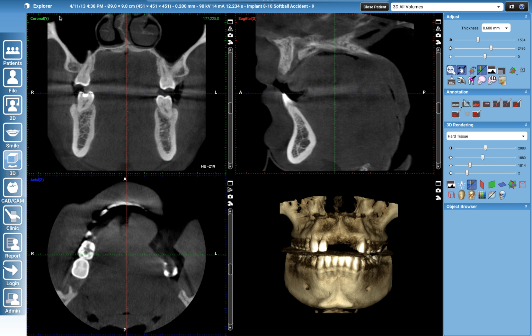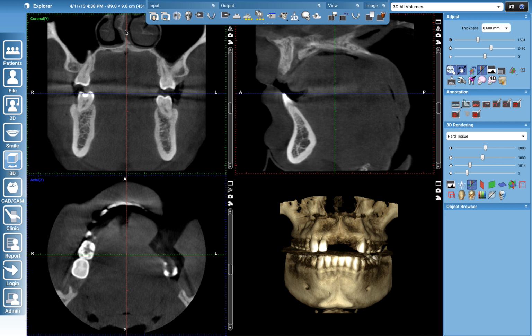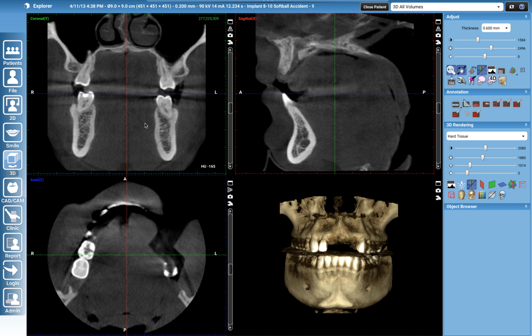Different implant case, an anterior implant case. And this is my second implant video. So if you haven't seen the first implant video, I would recommend watching that one because I will be referencing some of the same tricks and tools that I went into a little bit more detail on in that first video.